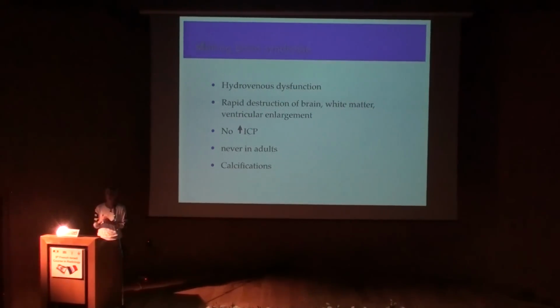And why is that important? Because sometimes people, like with this 3-year-old, this is an amazing example, send kids for treatment, and if you can diagnose that they're starting to have this melting brain syndrome, we think it's like apoptosis. This is something that gets started, it's not going to stop, and this is a very bad prognostic sign. So if you see those white matter calcifications surrounding the ventricles in kids with vascular malformations, especially vein of Galen, this is a bad sign. You're not going to help them so much.